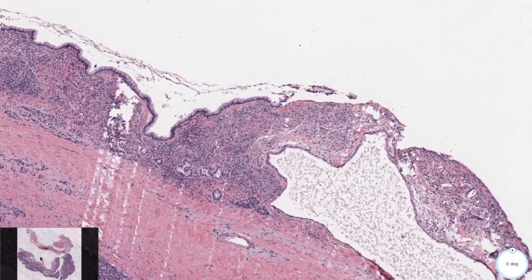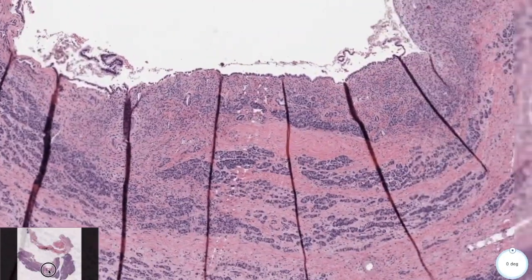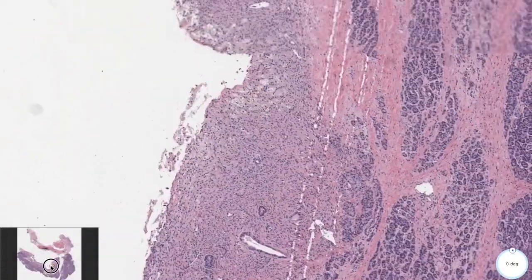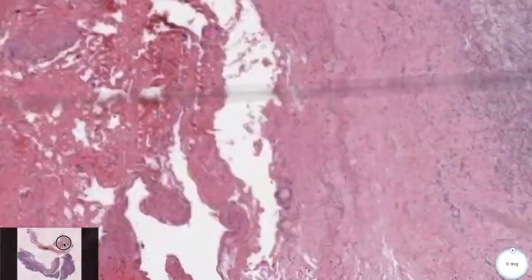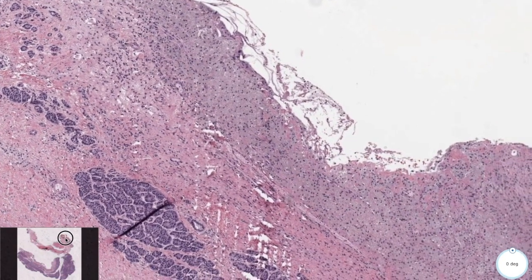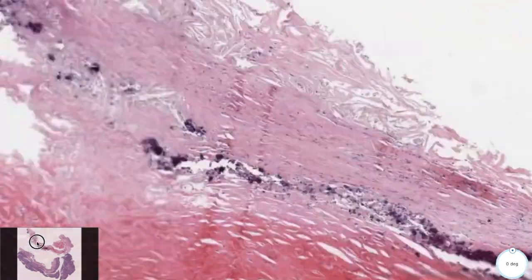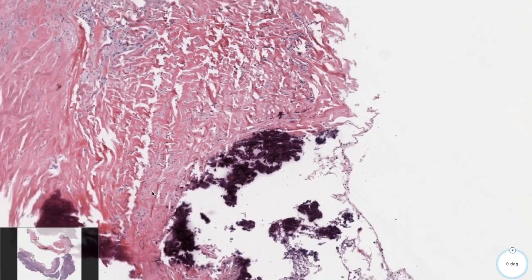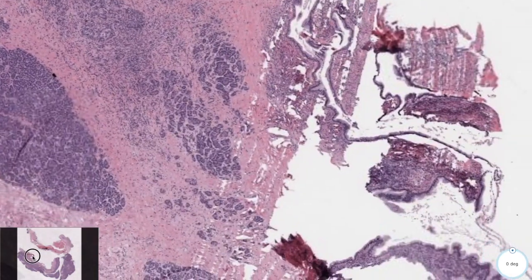So let's pretend that we're going to sign this case out. Ovarian stroma lined cyst. So far, from this power, the epithelium looks pretty unremarkable. It's generally low-grade kind of epithelium from what we saw. I was looking at here earlier, trying to find whether there was any epithelium present here. I am not seeing any epithelium on these sections, or at least on this part of the section. So really what we have to work with is right over here.